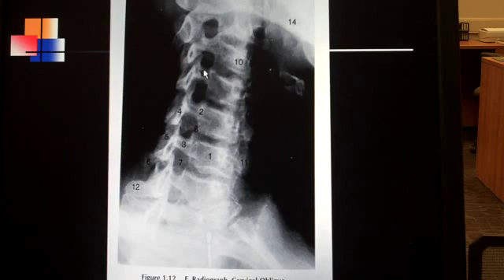Number 9 is labeling the pedicle. The pedicle is right here, and this is the pedicle that I'm going to describe in class as the bar, because you're seeing one sort of oblong, and you're seeing this one, which is this circle right here, and that's what number 10 is labeling on the segment above. That is the pedicle that you're looking at on end. And I use the word circle in class to describe this on lecture material and on testing material. So this is the circle, and this is the bar. Number 10 is on the circle, and here would be the bar. So that is 9 and 10.